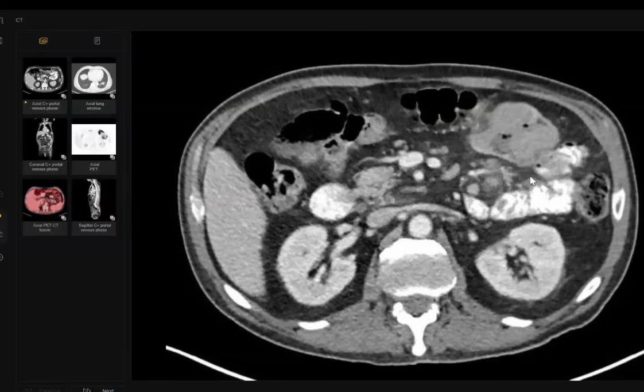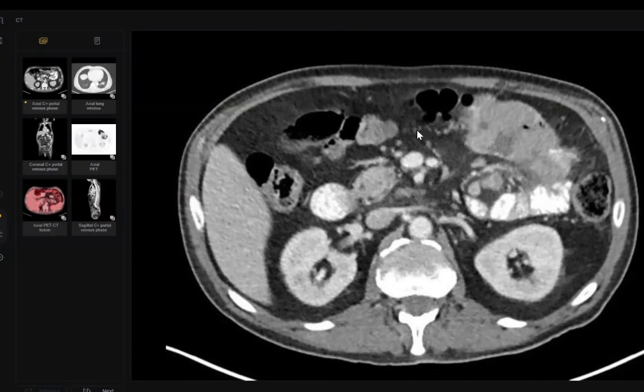One is adenocarcinoma and the other is lymphoma, and I would like to evaluate this patient further. I would like to first complete my staging by looking at the CT chest in the lung window, and I would also like to see the bones in the bone window. And for lymphoma, I would also like to go for a PET CT, as lymphomas are avid on PET scan. I would like to convey my findings to the primary and refer this patient to the oncology MDT.